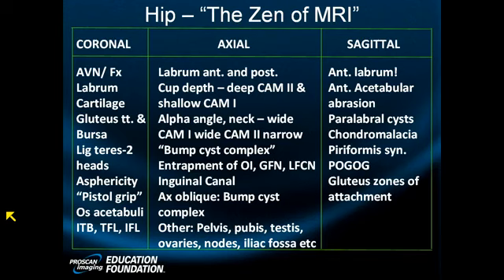And our sulcus: smooth, broad, triangular. Little fluid filling it up. Not a scintilla of swelling in the bone or cartilage. A nice tight capsule, a normal capsule. The relationship of the head to the acetabulum is normal. There's normal coverage. In other words, the drop-off is perfect. The acetabulum is not insufficient. So we don't have any secondary signs of dysplasia.